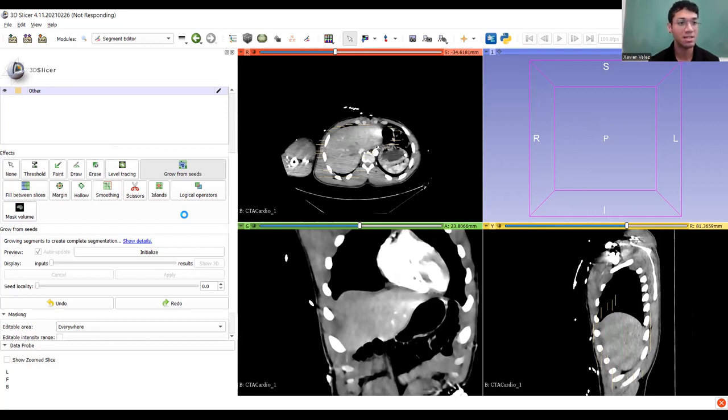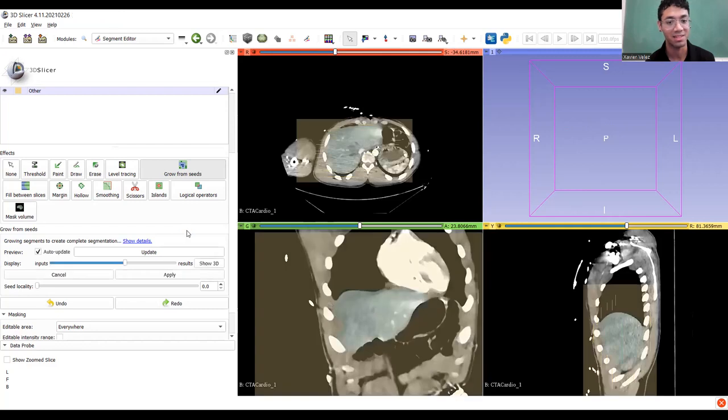So yeah, my Slicer says it's not responding. It does that sometimes. I'm hoping it doesn't crash. One thing I will definitely recommend is to save your work. I totally should have saved this before doing this step. Slicer is a pretty hefty program, and so it will often get tired and make your computer tired. And sometimes it doesn't like that, and it'll just quit on you. But we're gonna cross our fingers, and if it doesn't crash, I will save my work immediately. So, okay, sweet.